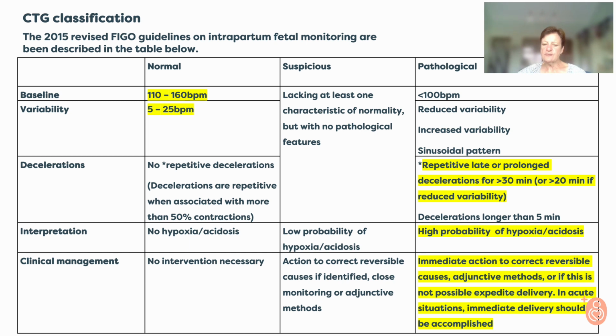Then we sit with these repetitive late decelerations, which makes our graph pathological. And the interpretation is then that there's a high probability of hypoxia and acidosis, and we need to immediately start with resuscitation of the fetus.